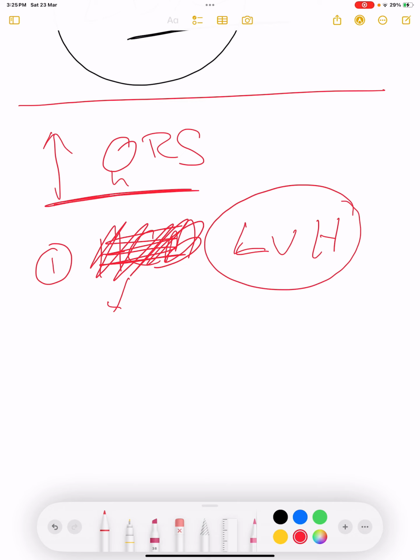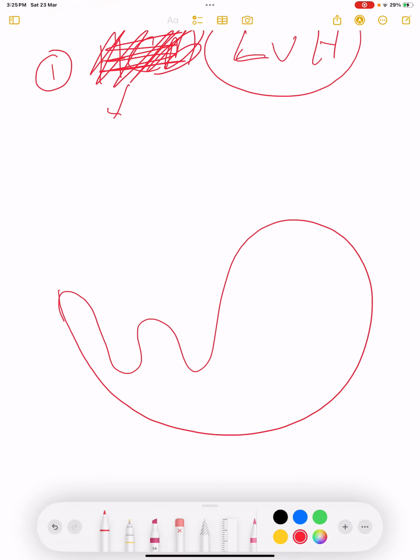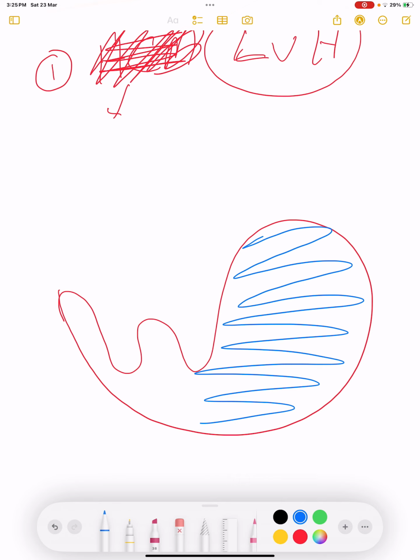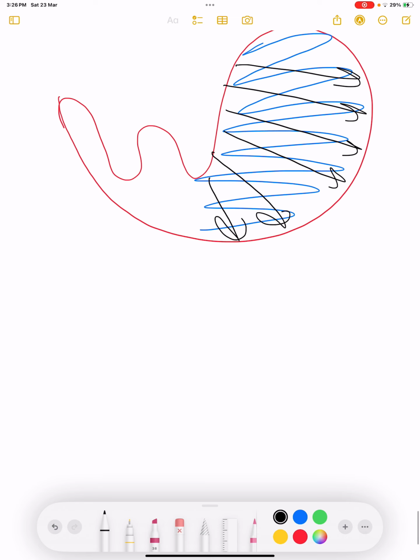Left ventricular hypertrophy. So what happens in left ventricular hypertrophy? The left ventricle will be hypertrophied, most likely due to persistent or chronic hypertension. You remember, the vectors will be big vectors, huge vectors. This huge vector toward the left side and huge muscle mass will generate a huge voltage, and this will lead to a huge QRS complex.